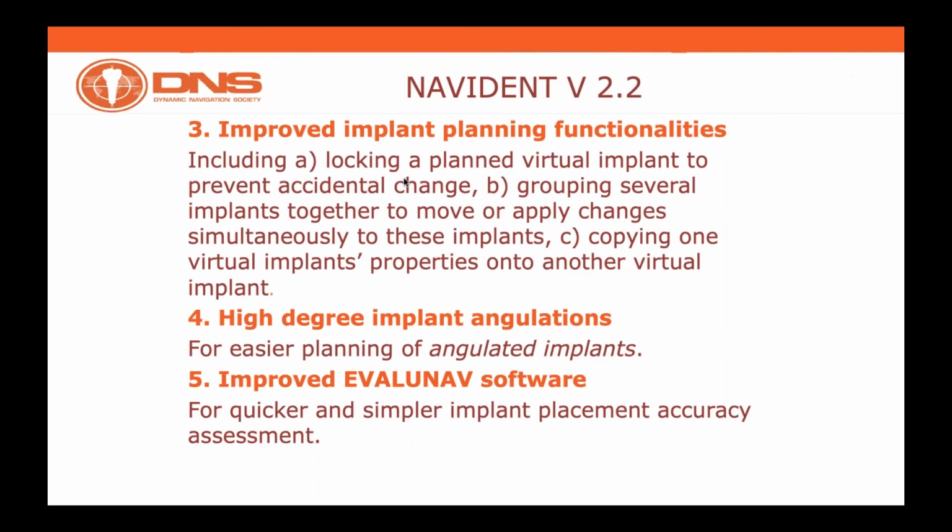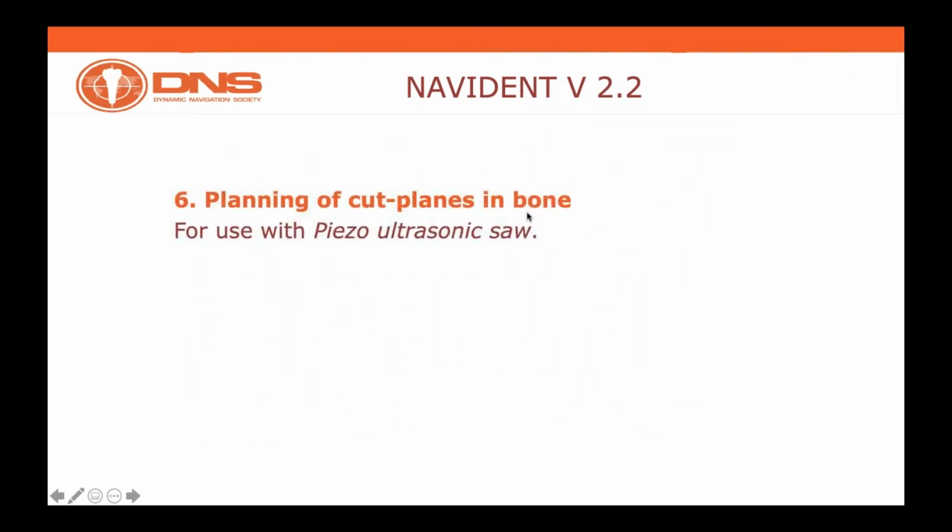Well, the Evalunav software has been improved and simplified, and therefore is very simple now. The process of matching the whole thing together is very easy and intuitive.